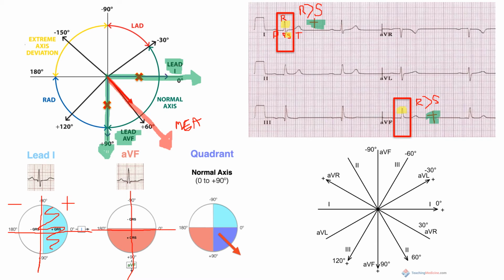Next, what you want to do is go ahead and shade in the area. So for AVF, you guys, this is going to be the positive side. This whole entire side is the positive side. Let me just write it for you.